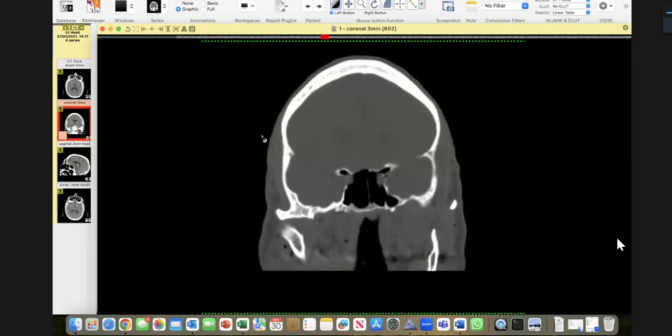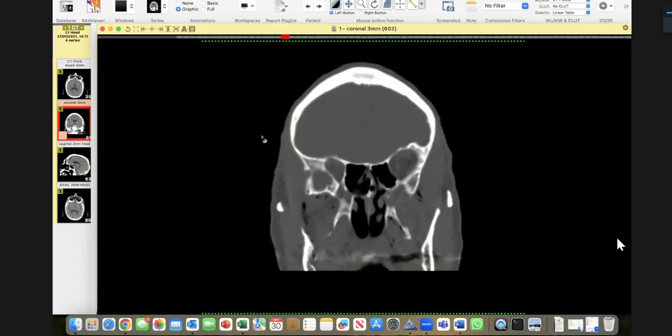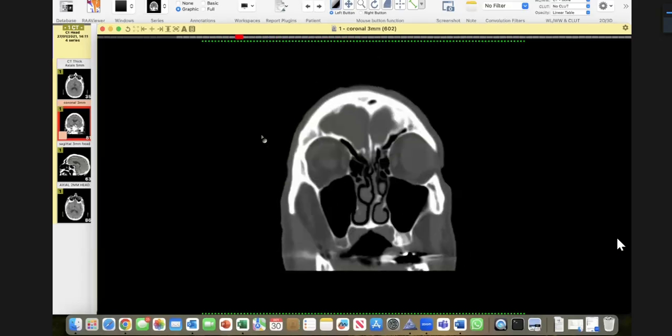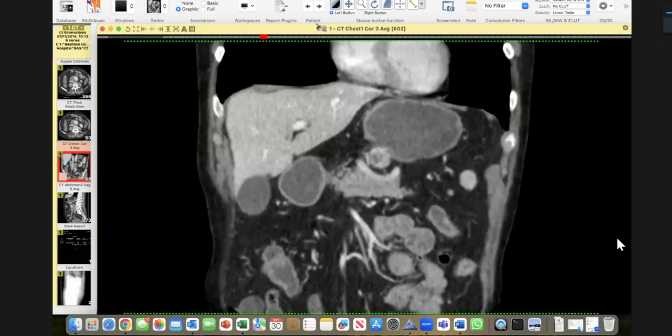You were also looking for any bony abnormality to explain that. So this was an incidental finding, and I warn you, this case has come in the exam in the past.